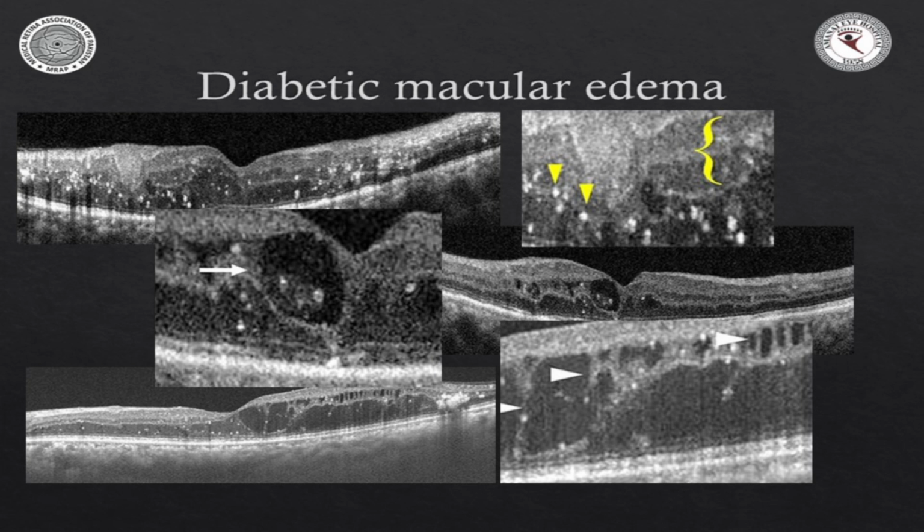And then the hyperreflective intraretinal foci themselves, studies have shown that they are correlated to the HbA1c. यानी जितना पुअर ग्लाइसेमिक कंट्रोल होगा उतने आपको ये डॉट्स ज़्यादा नज़र आएंगे. Already you know that this patient has a lot to work on as far as systemic comorbidities are concerned, and you spend some time with the patient letting him know that just an anti-VEGF will not make a difference here.